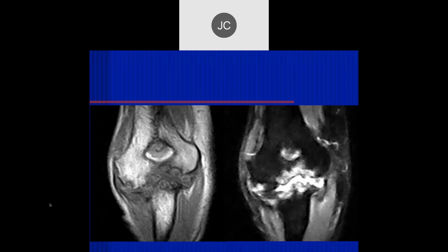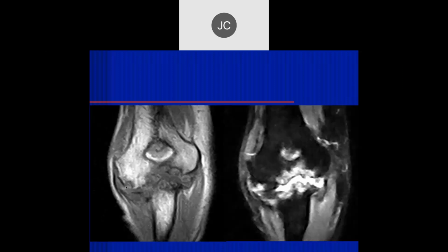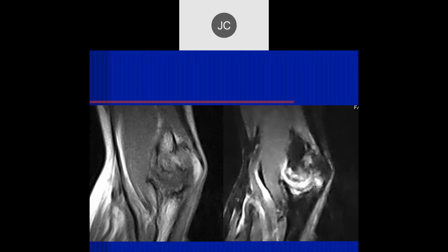All right. So there is effusion. Looks like a lot of destruction of the articulating surfaces there. There's not a lot of synovial thickening on this one. There's some synovial thickening in through here, but the periarticular erosion is not as common as I would feel like this. It's like hemophilic or something. This really involves the articular surfaces here, which is a little bit atypical for rheumatoid.